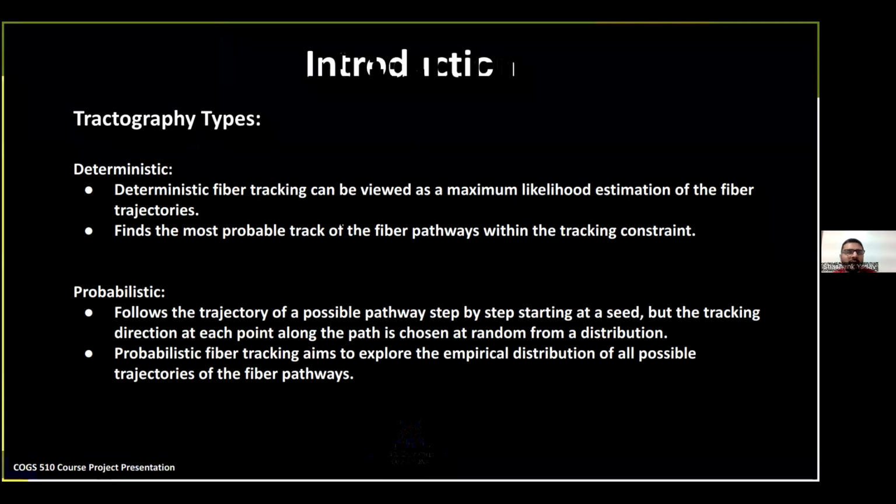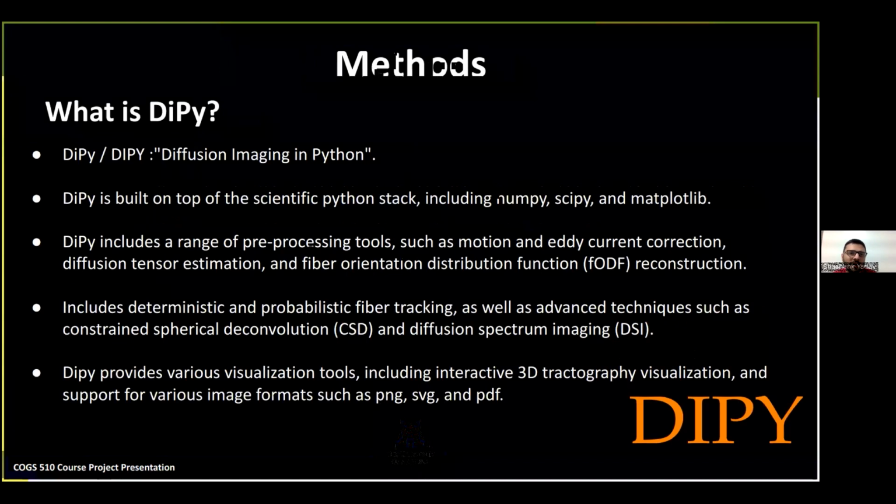There's another tractography method called EUDX, and we'll get to know about it in further slides. It is one of the tractography methods available in the DiPy software.